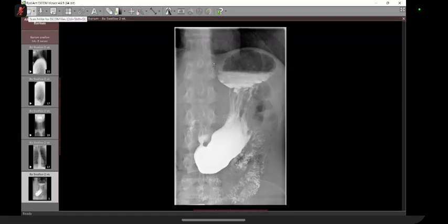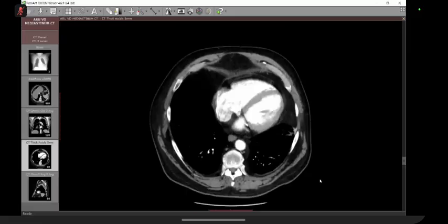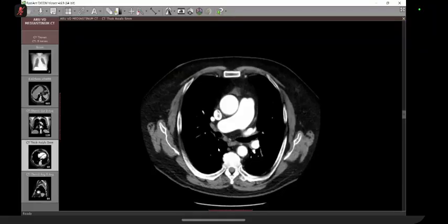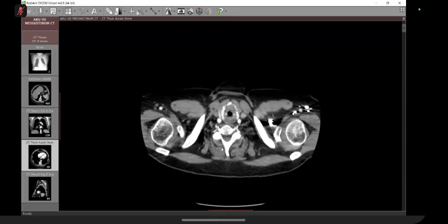So then please concentrate on this one. This is the main part of this session. This is the CT scan of the esophagus. Today we are going to go organ wise, so that you are not overloaded. In the abdomen, I've just selected a single CT, but in each session I'm going to teach you the relevant bit. Stomach only, then in the next one, small bowel, then the large bowel, then the liver, then the pancreas, that kind of thing.